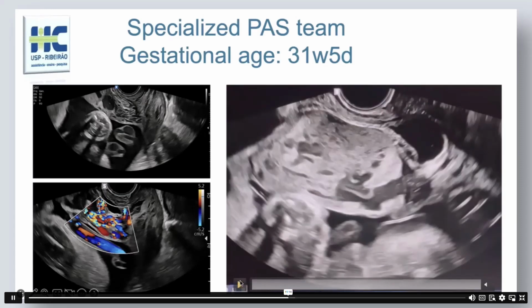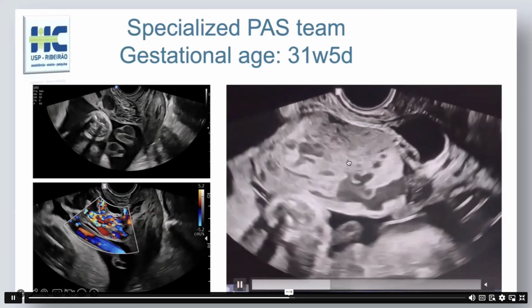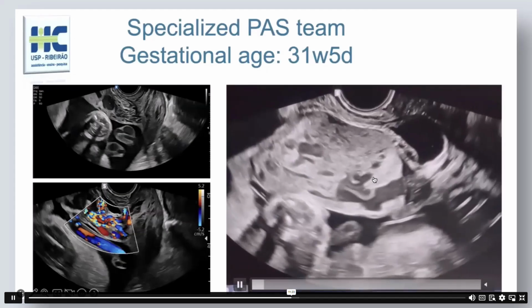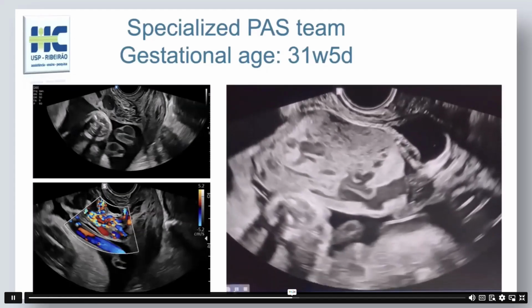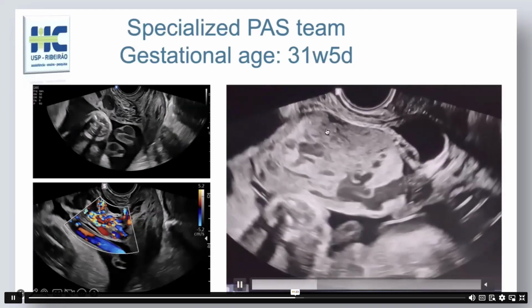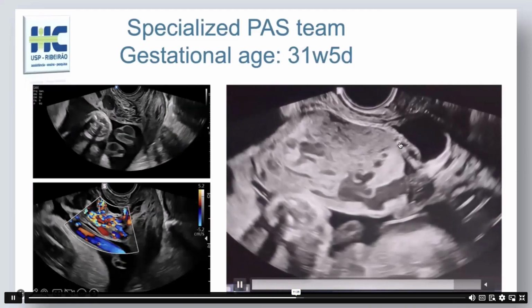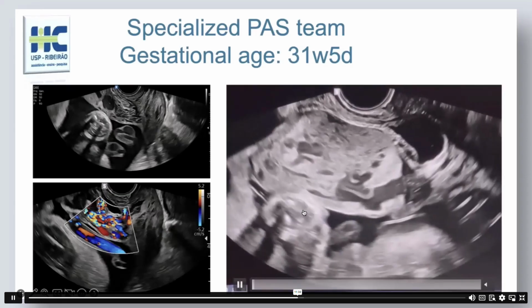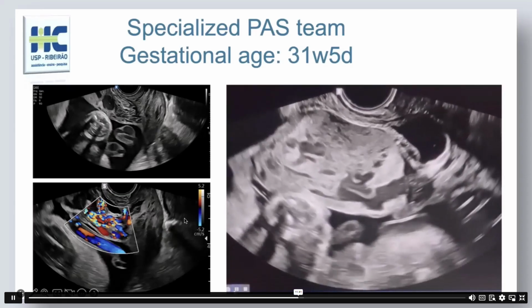And as you can see here, all signs of placenta accreta spectrum, but interestingly, in a higher placenta, not close to the cervix, because this patient had a previous corporal C-section at 23.5 weeks in the last pregnancy. That's why we can see all this bulging, no myometrium, loss of clear zone, all this hypervascularity within the placenta and within the cervix.